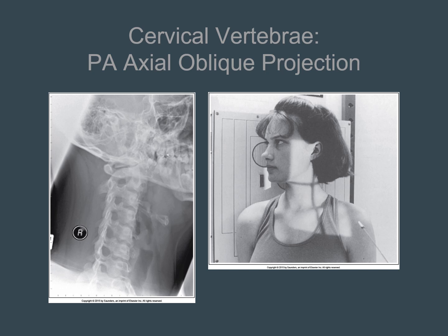The inferior mandibular rami demonstrate about ½ inch between them. The posterior arch of the atlas and vertebral foramen are seen. The intervertebral disc spaces are open. The cervical bodies are seen as individual structures and are uniform in shape.